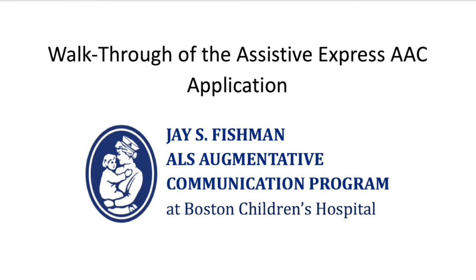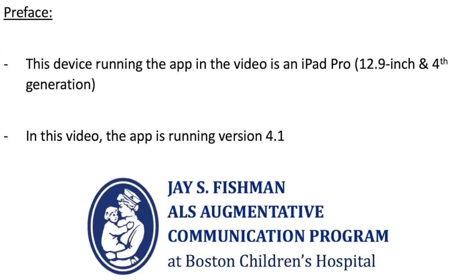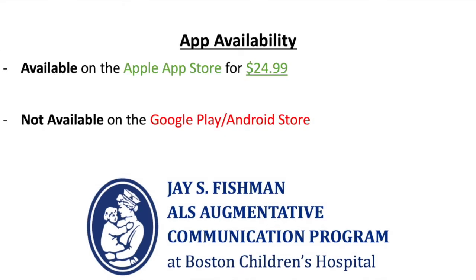This video will provide a walkthrough of the Assistive Express AAC application. Before the video begins, here are a few things to keep in mind. The application was running on an iPad Pro 4th generation, and the app was running software version 4.1. When this video was made, the app was available on the Apple App Store for $24.99 and unavailable on the Google Play and Android Store.